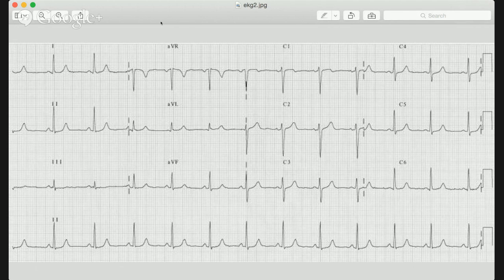So, I have a question. Time out. Yes. So are you saying that step 3 is you're determining the axis, or you specifically have an EKG here with axis deviation on it? I am in step 3. We were going to determine whether the axis is normal, whether there's a left axis deviation or a right axis deviation. We're going to keep it simple, okay, Mr. Vickers? Great, buddy. All right. Does that answer your question? It answers it above and beyond my expectations. Very nice. Let's proceed.